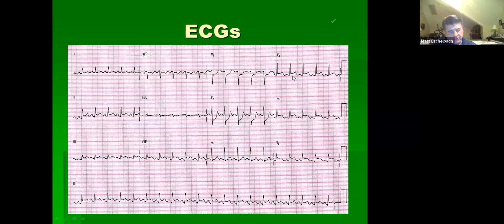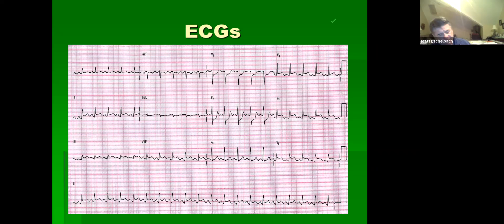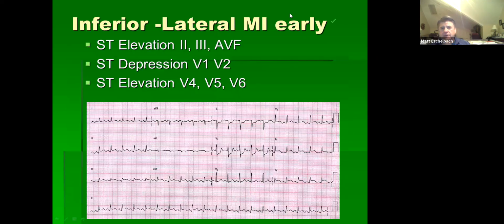So do you want to call this a STEMI? Yeah. What regions? Inferior. Inferior and lateral, right? Yeah. Good. So inferior lateral MI, a little bit early, but everything you talked about is right there. Perfect. Good job.